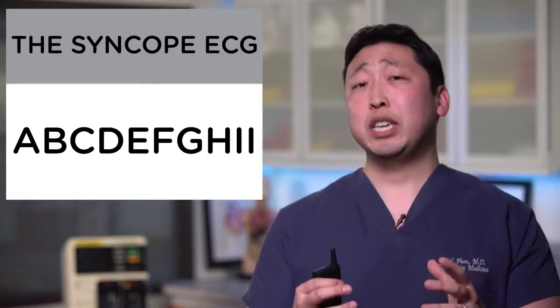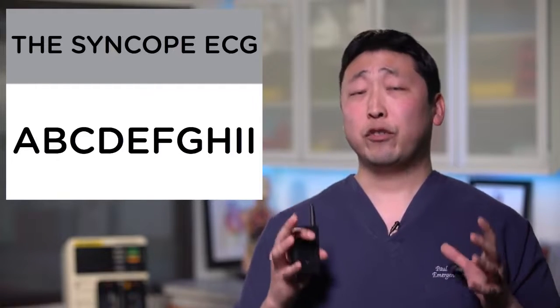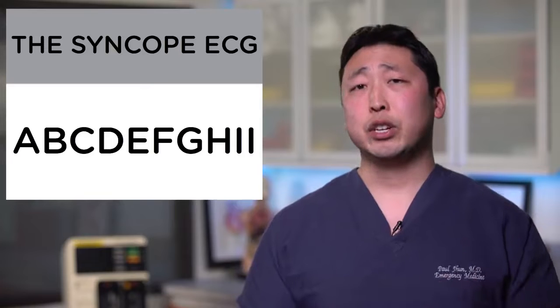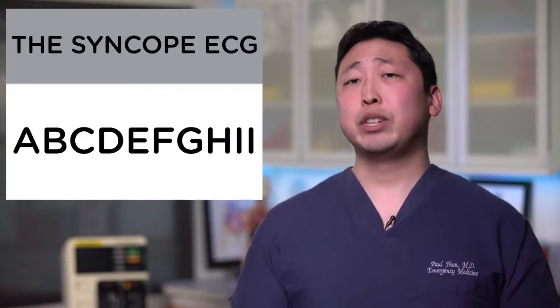G is for giant PE, or pulmonary embolism. You're looking for the saddle embolus, right? And you're looking for acute right heart strain: either an incomplete or complete new onset right bundle branch block, right axis deviation, inverted T waves in leads V1 through V3, or maybe the S1Q3T3.